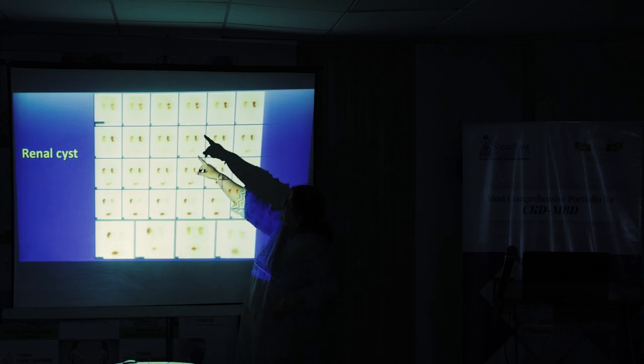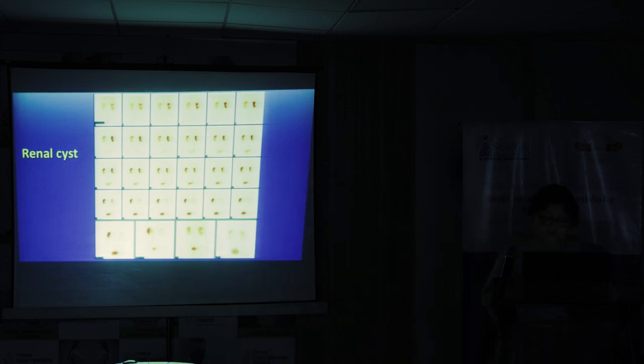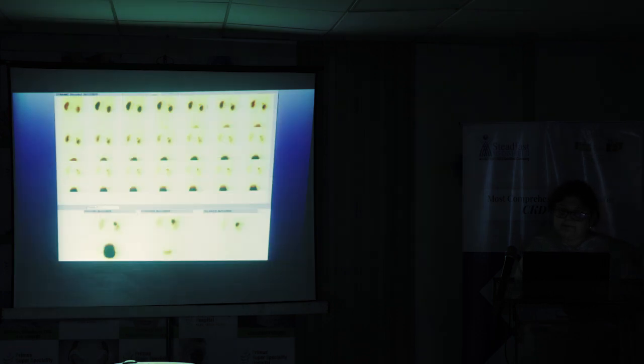So right from the beginning, there is this hole which continues, and this is actually a renal SOL or a renal cyst which will look like this. Okay, this is a very interesting study. Can somebody take a guess?